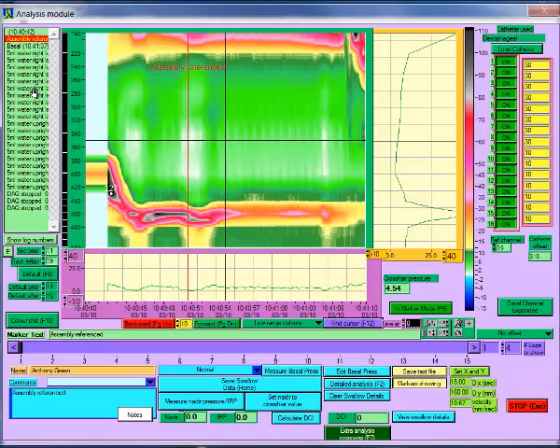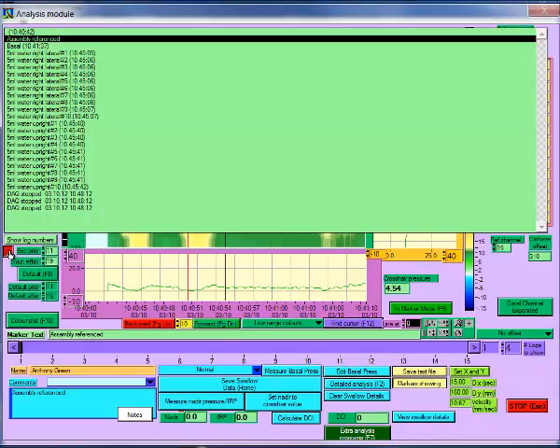The markers that were entered during the study are listed in the text box on the left. If you can't read one of these properly, click on E, which will expand the text box. Click on the button again to return the text box to its normal size.